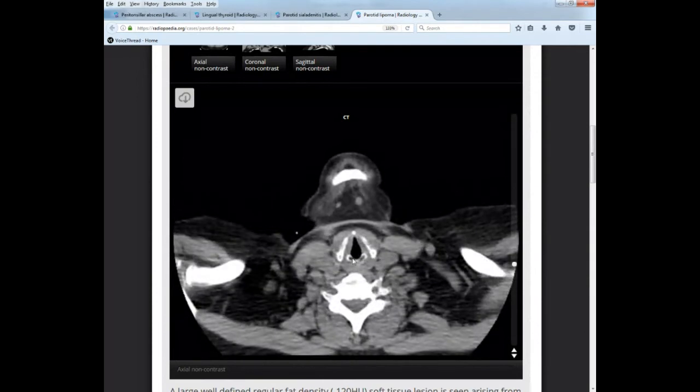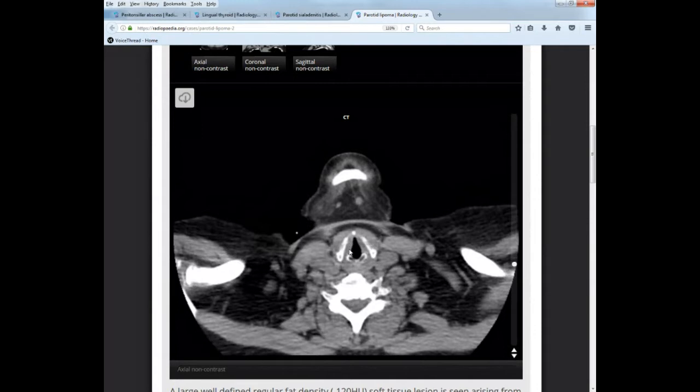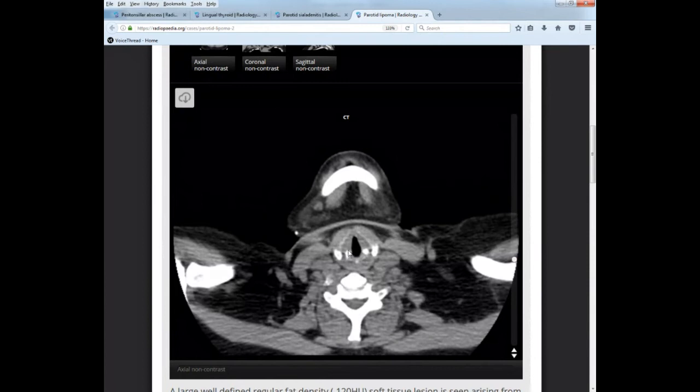Okay, and the opening, remember the glottis is the opening created by the relaxed vocal cords during just relaxation, not during phonation. When we have phonation, these vocal cords, which are in here, are closed. You can't quite make them out, but I know they're here because they're attached to the arytenoid cartilage and then anteriorly to the thyroid cartilage, which I can just make out here. So when they are closed and not in a relaxed position, remember these come together, pushing these two vocal cords in together, creating just a tiny slit here. So when the air passes through, it makes a noise.